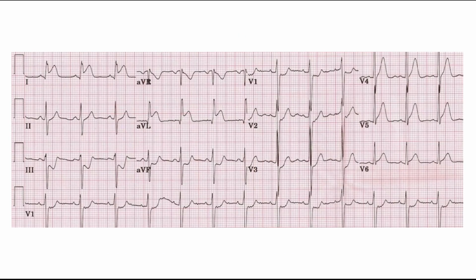Over here, we're looking at our ST segment elevations, but before that, remember that we've checked: is there a P wave before every QRS complex? Okay, yes. We've looked at the rate, counting 300, 150, 100, 75, so it's a little bit between 100 and 75. That's a normal PR interval, that's a normal P wave, that's maybe a little bit wide of a QRS. The T wave is pretty peaked off of the baseline, but there might be something else going on here, especially in V1. Oh, there are some ST segment depressions. We look at our axis, it's about normal.